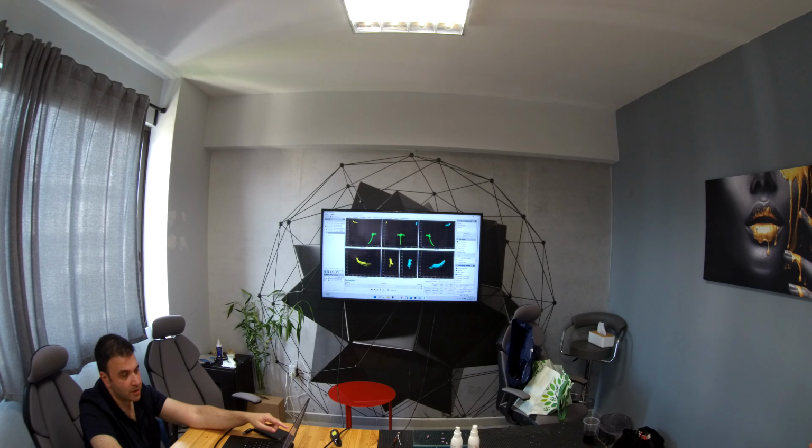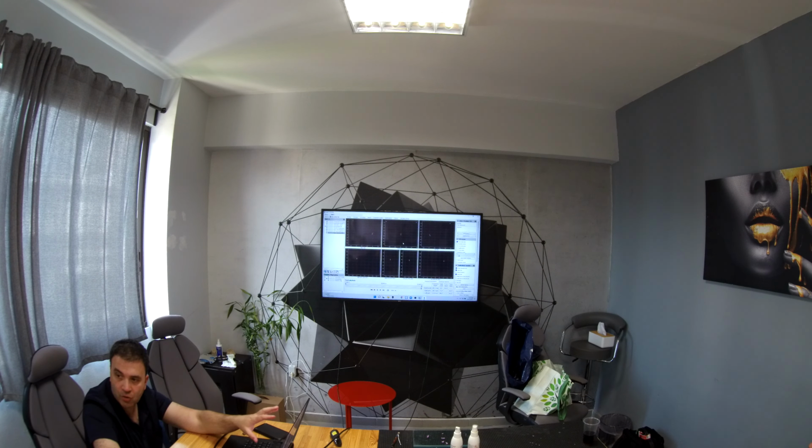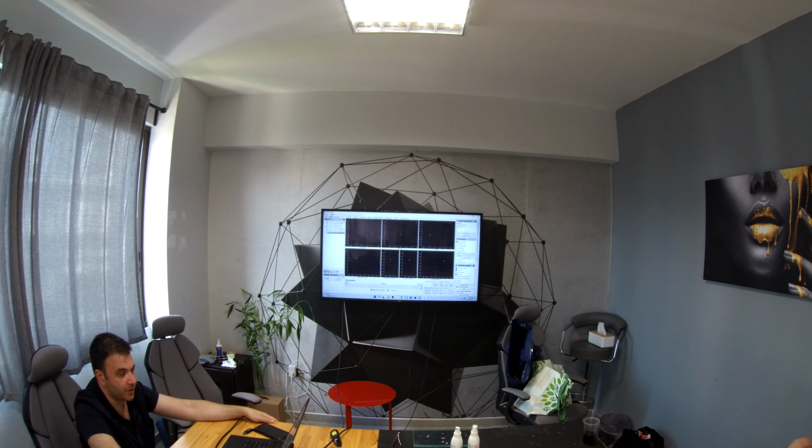Left mouse button. You see it's active. You press it again, and it disappeared. So right now, on the 3D view, there are no mixture of axiographies. But if it is plus here, we have all the movements that we did, and the names that we gave to them. Do you see that?